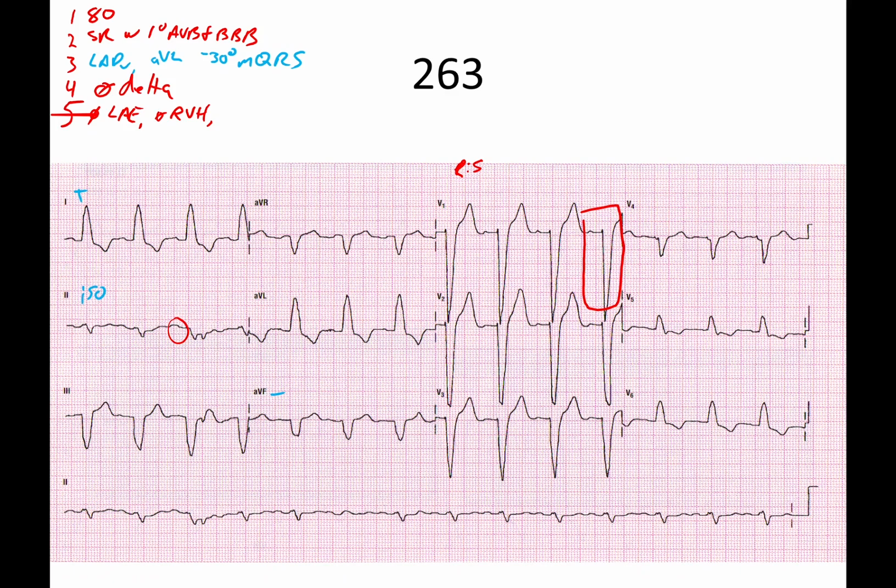And so then we need to look for left ventricular hypertrophy or left ventricular enlargement. And normally what we would do is we'll just go ahead and measure it out: 10, 15, 20, 25, almost 30, and you can add, we'll say, so we meet the requirement of the S plus R waves greater than 35 millimeters. But the problem is this: they have a bundle branch block. And if it is a left bundle branch block, that completely removes your ability to use that as your criteria for measuring it, simply because a left bundle branch block affects conduction so badly. And so until we figure out whether this is a right or a left block, we cannot measure left ventricular enlargement until we know for sure. So let's take the time and figure out what we got.